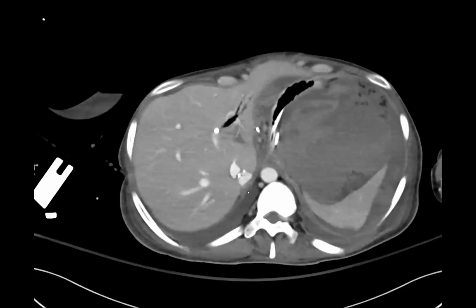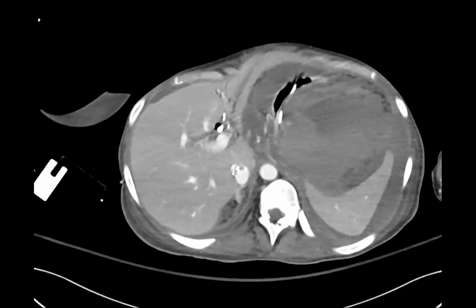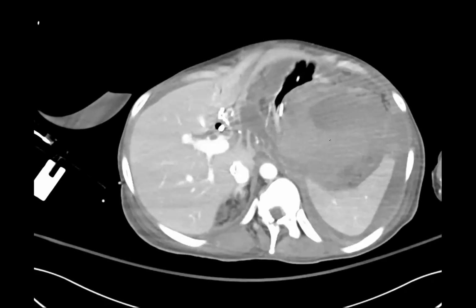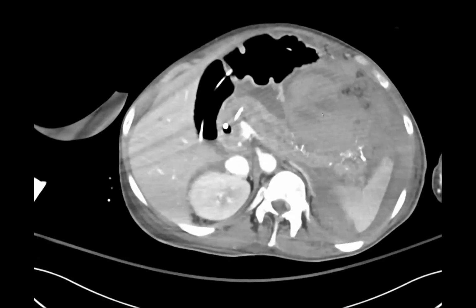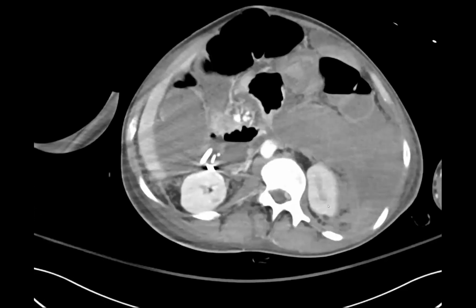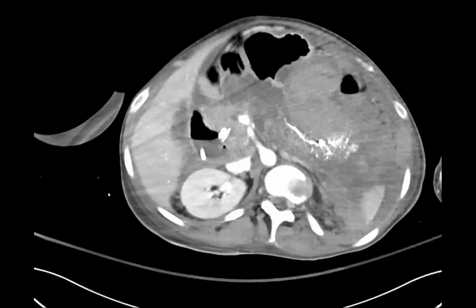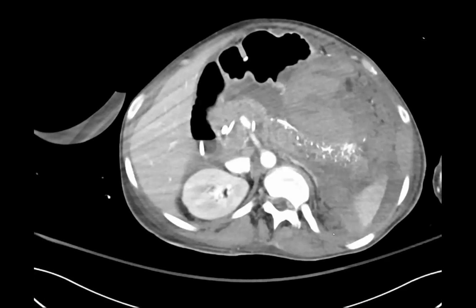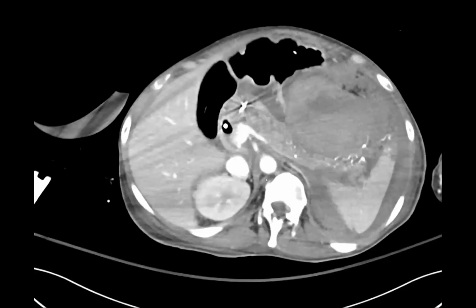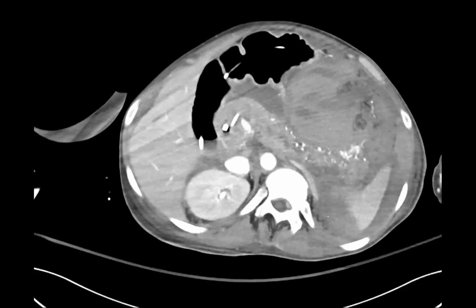And post-liver transplant, they had a hematocrit drop. And you can see here that there's a big hematoma. It's kind of a nice look for a hematoma. It's got heterogeneous but hyperdense areas. But what do you guys think about the pancreas? Very calcified or enhanced. It looks like it's enhanced. It's got a very odd enhancement pattern. Okay, an odd enhancement pattern. Somebody said calcifications. Good. So there are all these densities here, right?